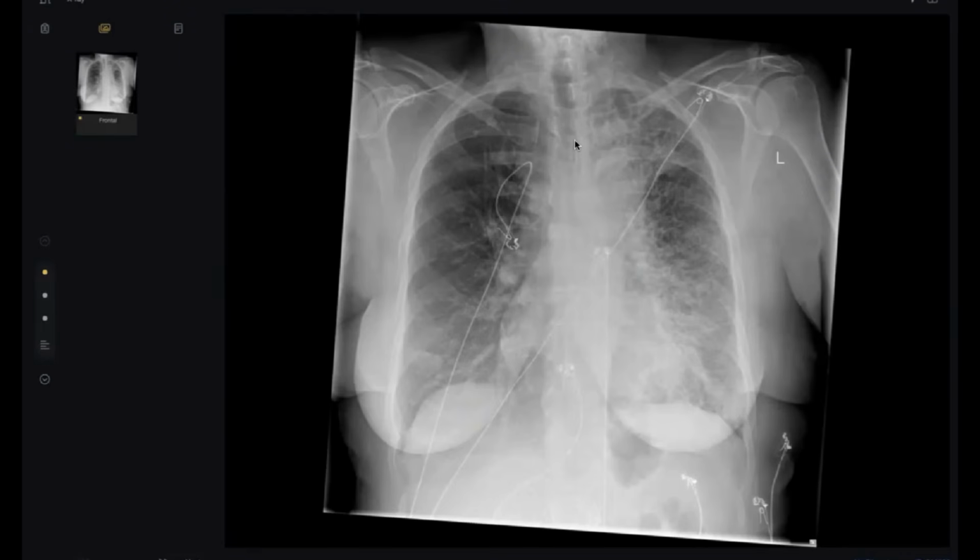So this is unilateral. Second, it could be some old process occurring on the left lung, more marked. So this patient should be followed by HRCT chest for further evaluation. No pneumothorax is seen on this study. The bones also appear unremarkable. I will also see the previous X-ray. Is the previous X-ray available? What history should you ask about? Previous X-ray, I will also see whether the changes were present or not. Which history should you ask about?